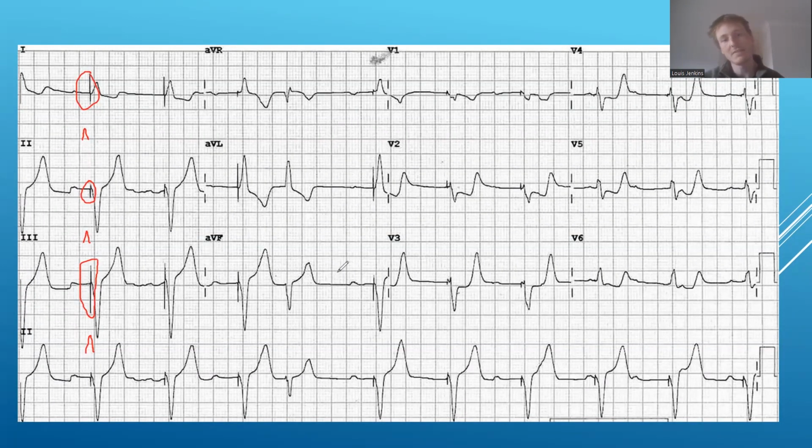We've got our pacing spikes here. They look like they're coming fairly regularly. We have an ectopic beat here that offsets it a little bit. And we do have some P waves that seem to be marching through without too much irregularity. So maybe the underlying rhythm here.